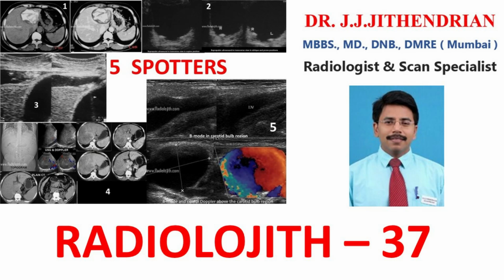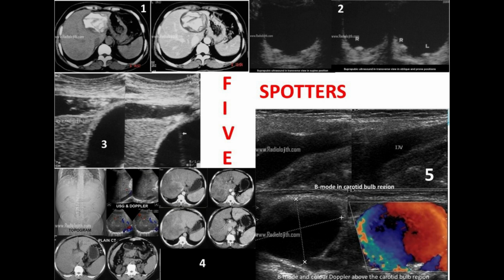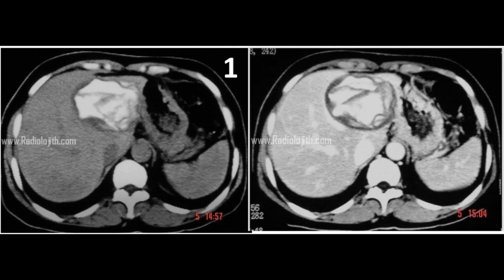I am giving you 5 spotters for your perusal. I'll give you a few seconds for your attention. If you want more time, please pause the video. Okay, let's go. This is the first case. Take your time. Are you ready? The answer I'll tell you.